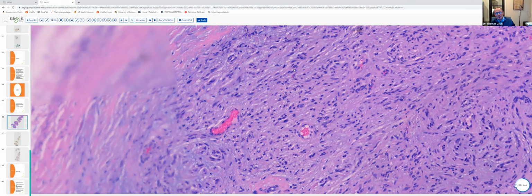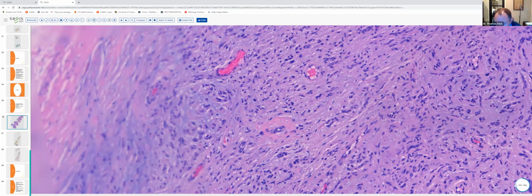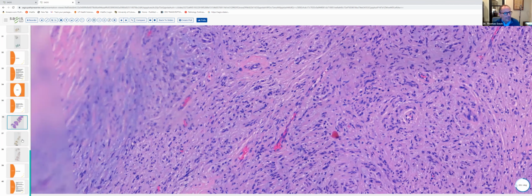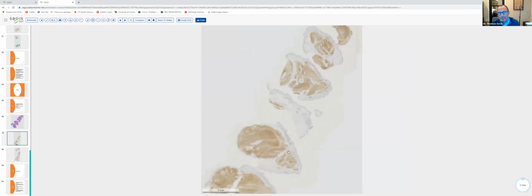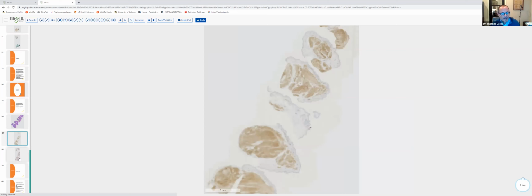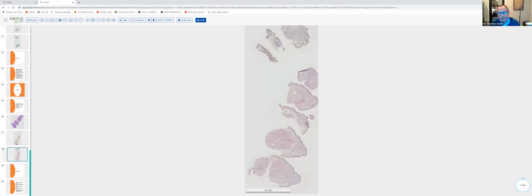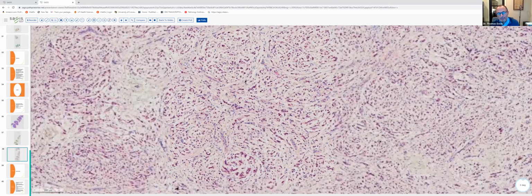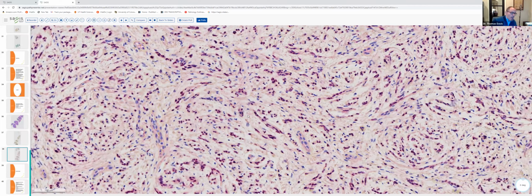Okay, so these are extremely delicate. And again, these are embedded within a somewhat myxoid stroma. And hopefully the configuration of the nuclei here made you think about a neural tumor. This particular tumor was S100 positive. This is a little out of focus, but you can see it picked up the stain. And the tumor also stained, this is a little bit of a cleaner immunostain, with SOX10. So you can see nice nuclear decoration of SOX10, and that combination of stains confirms a neural origin.